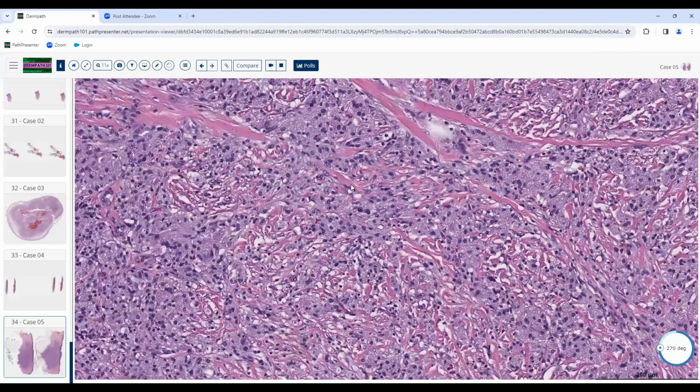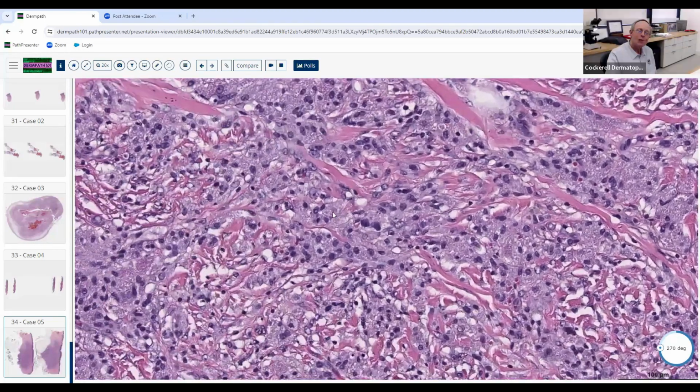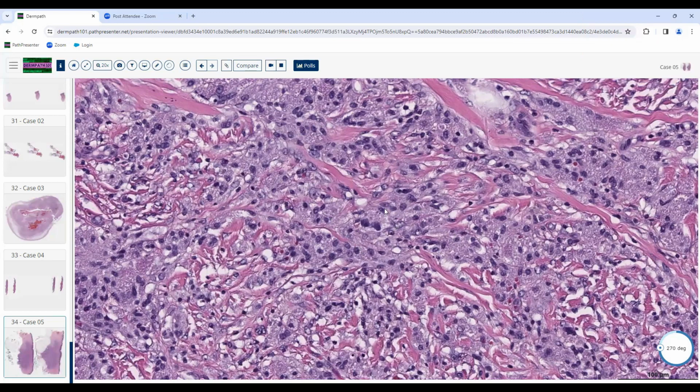The heparin, histamine. Good idea, because they are granular when they're inside mast cells, but these are not mast cell granules. The granules here are basically lysosomes that have engulfed a breakdown product of Schwannian myelin material.